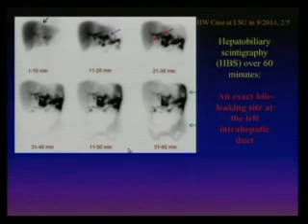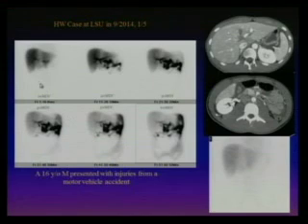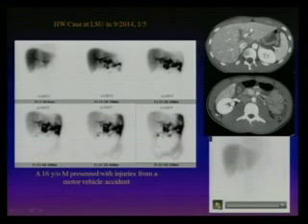How much longer after, do we have a time frame? This is always the universal protocol: the patient comes in for a 60-minute dynamic image. So this is 60 minutes. Of course, this is a screenshot. Technologists just fuse 10 frames, so this tells you 10 minutes, 20 minutes. But when you look at the reading station, you will see 60 frames. They can fuse whatever they want, but you know that's 60 minutes. This cine is just around 60 minutes.